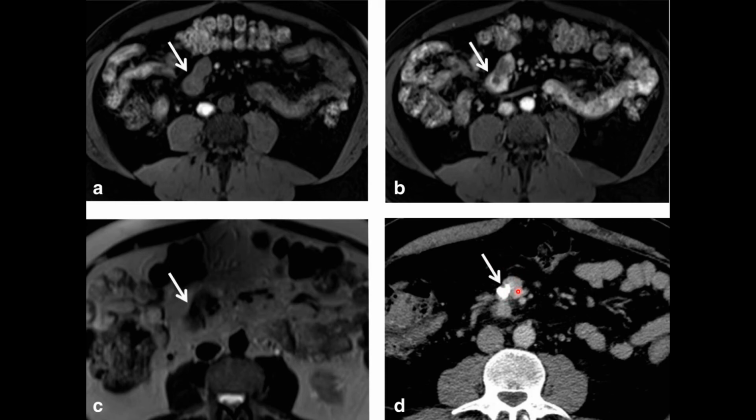So this is not a classical case though, but this arterial enhancement tells us that this is a very enhancing lesion, an arterial enhancing lesion. Presence of calcification clinches the diagnosis of carcinoid tumor. We saw this feature: if there is ill-defined margin, very enhancing tumor, then it's usually a carcinoid tumor.